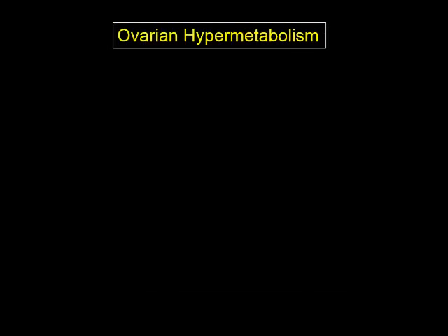So this is actually a fairly common conundrum on PET scanning, is what to do with ovarian activity in particular, because we know that certain tumors have a propensity to metastasize to the ovaries. So the question becomes, at what point do you say that that activity is perhaps suspicious versus which point you let that activity go as physiologic?